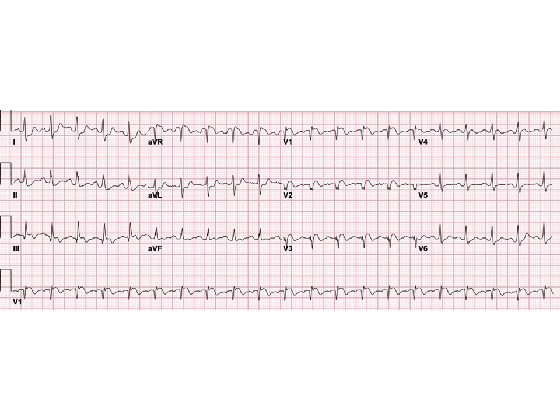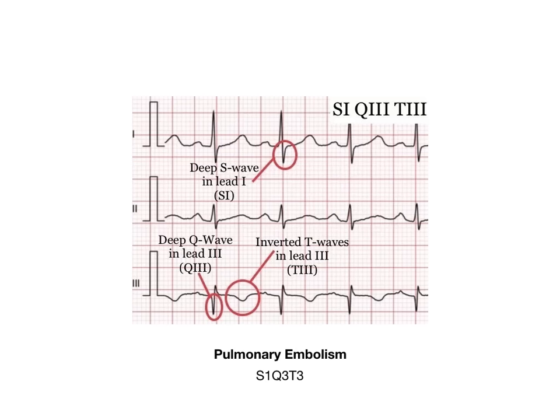Now this is tricky, and it's honestly beyond the level of a medical student, but it still shows up on USMLE and COMLEX because of how high yield it is in terms of being able to correlate this with a pulmonary embolism. So for whatever reason, when somebody has a very large PE, and this is more likely in something huge like a saddle embolus, they get classic findings on the ECG. And those are shown here on this slide.